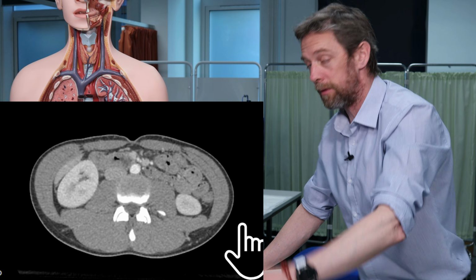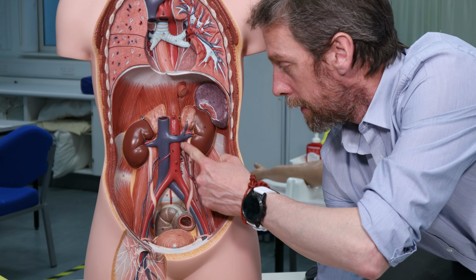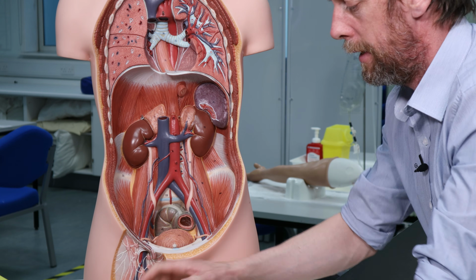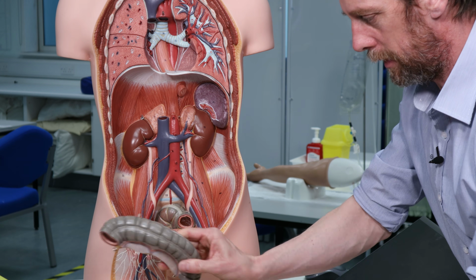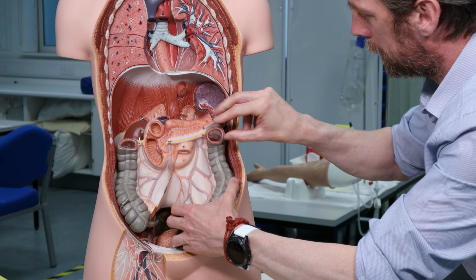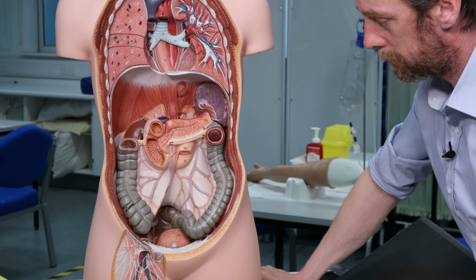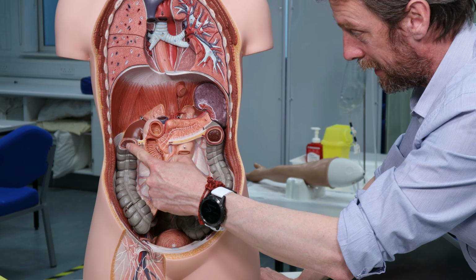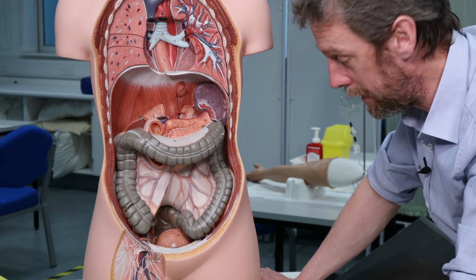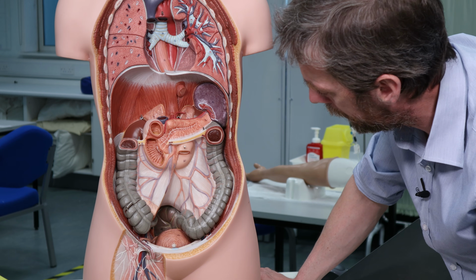All right. So if we compare that with the model, and I rebuild this, look, see that there's the abdominal aorta splitting into the two common iliac arteries. It's the best way of doing this. If I put this in, cecum, which is pretty reliably there. Ascending colon, transverse colon. As I said, it's got a mesentery. Descending colon, sigmoid colon there.